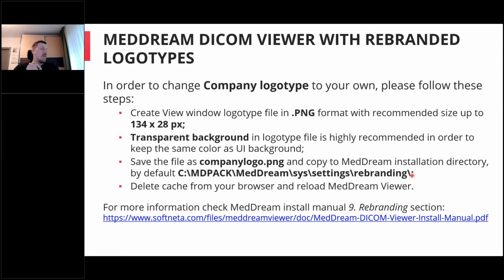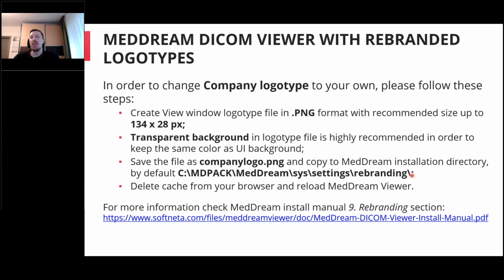So doing this allows you, if you have, for example, an already working environment or even a test environment which other colleagues are using. As you saw, I just changed the logo and I didn't need to restart the MedDream service, so it was not interrupted by a MedDream service restart or a server restart.